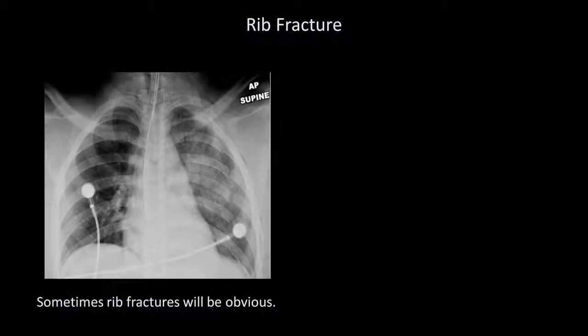First, rib fractures. Sometimes they will be very obvious. In this case, the patient has numerous fractures of his posterior left ribs, almost certainly from high-impact blunt force trauma.